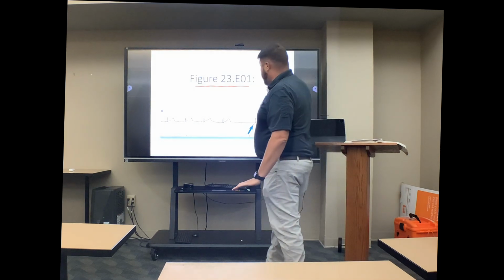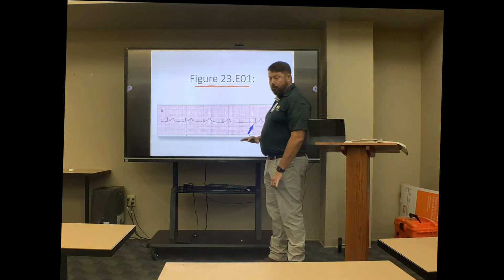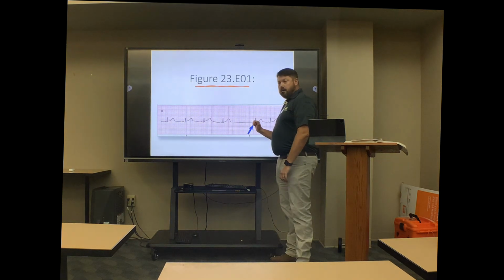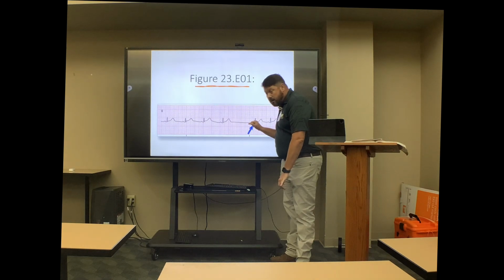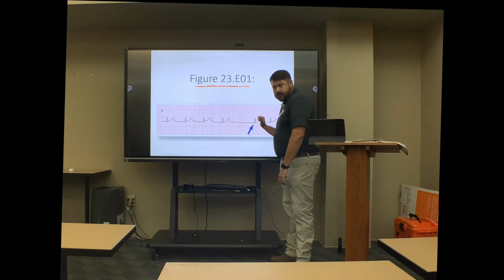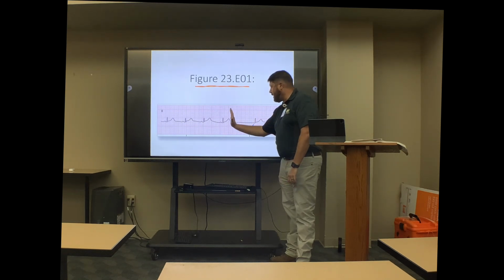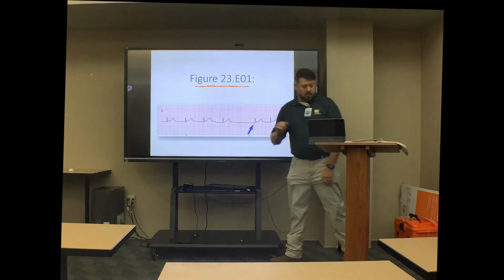All right, so the whole rhythm itself is not a junctional escape rhythm. What is this? All right, so it did go inverted, but it does occur after our next expected beat. So this would actually just be a junctional escape complex. All right, same rules as a PJC, except a PJC would occur here. This occurs here. Make sense?